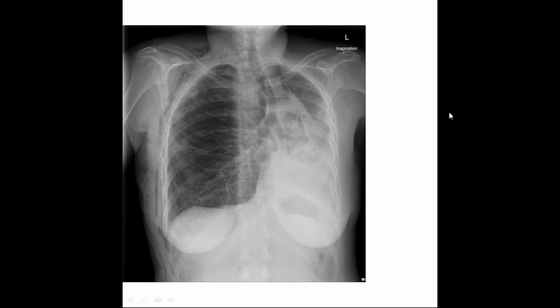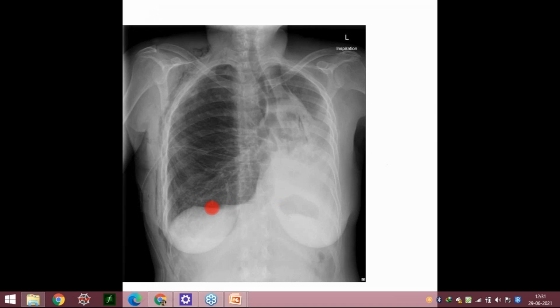If you see this, some tumor before that. Yeah, fibrosis. This is the right hemidiaphragm. You're not able to see the left hemidiaphragm. For this very reason, because there has to be some fibrosis somewhere here, which has pulled the trachea towards the left, and it has pulled the trachea up.